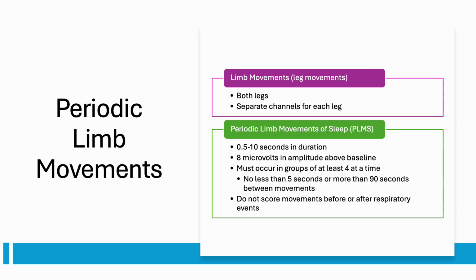and you will score a ton. I've had studies that I've marked up to 500 or 600 limb movements, and that means an extra 500 or 600 clicks on the mouse. When you're staging studies, you're pressing a button for each epoch of sleep, so that's somewhere between 700 and 800 button presses. When you're scoring events, you're advancing forward through the study using arrow buttons. So that's another 300 or 400 clicks because you're usually looking at 2 minutes at a time. Lots of clicking.